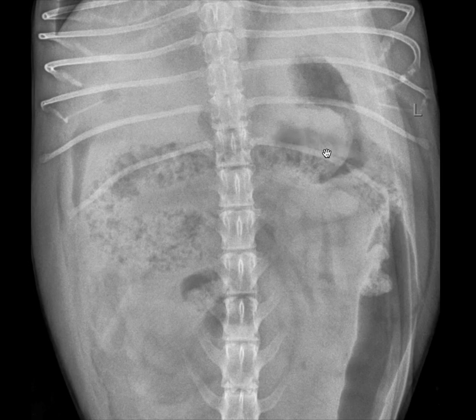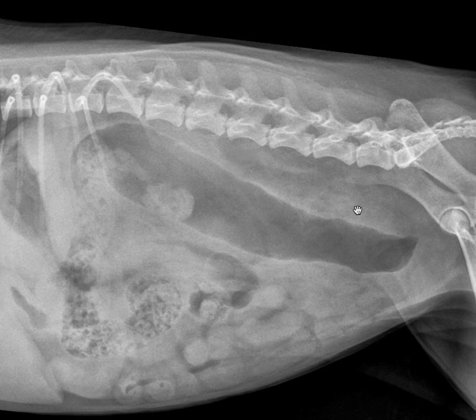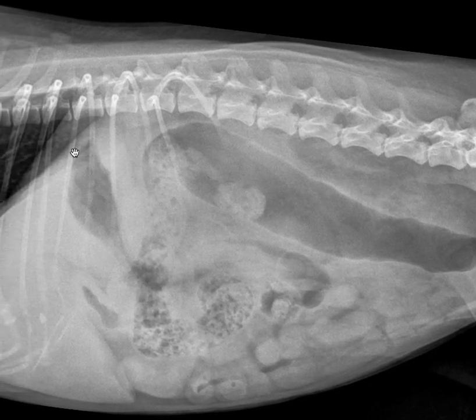So if I were to summarize my findings for this case, I'm very confident that there's retroperitoneal pathology. You can see it's a little less obvious on this view than on the left lateral, but it's still there. The gastric abnormality is really only seen on one view, so I'm less certain about it. Therefore, here's how I would conclude. Retroperitoneal fluid and mass effect.